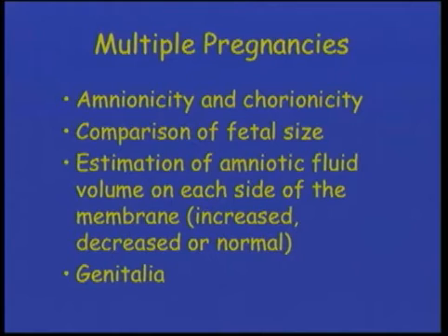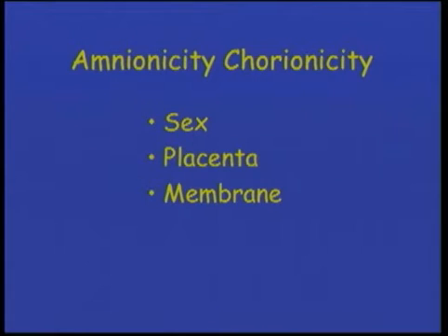We generally do a single pocket. The guidelines tell us we should at least say whether they're increased, decreased, or normal, and they do suggest that we should look at the genitalia and report it. And that's because the genitalia will help us with the amnionicity and chorionicity.